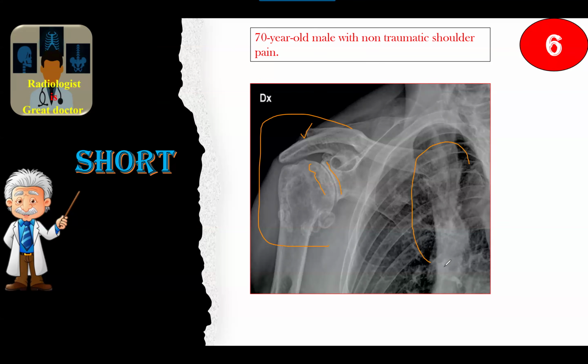But I'm suspecting something here. Usually in the exam, by the way, it is one pathology. I'm not encouraging two pathologies in the radiograph, but we will see. This is the first experience we will gain. We need here a full chest radiograph and correlation with maybe occupational history, because this may be a form of fibrosis.